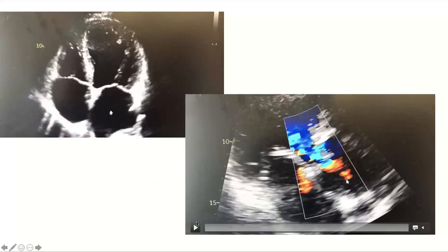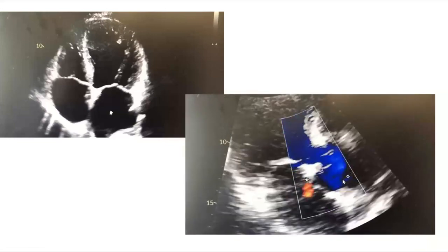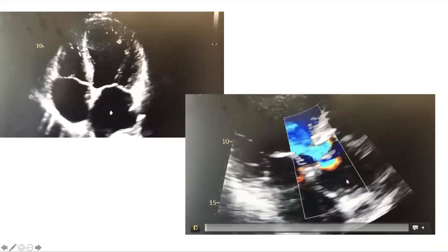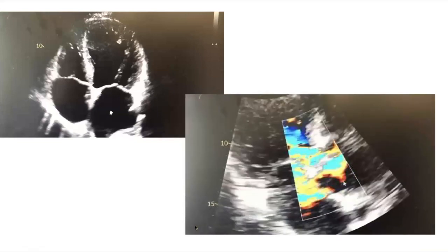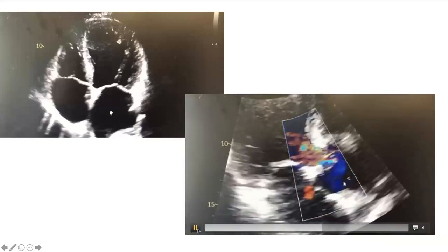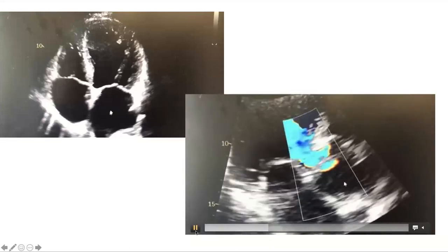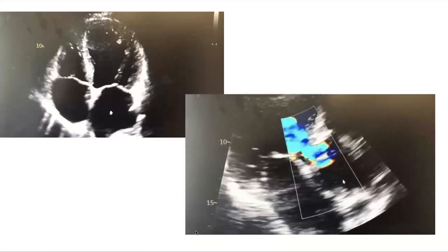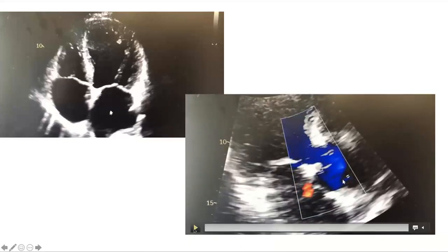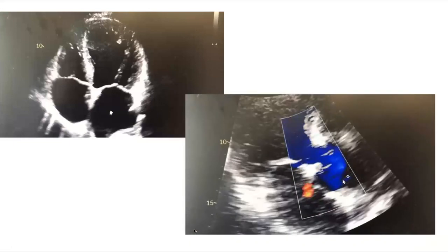Absolutely. And then last one here. Terrific. So this looks to be a zoomed in three-chamber apical view. So apical three-chamber, which has been zoomed in to better show the aortic valve. And it's showing that the jet is, I think, showing us the vena contracta just being very large, and I think it's also showing, the question is, is the jet centrally eccentric? I think based on the compilation of views that you showed us, it's predominantly central.